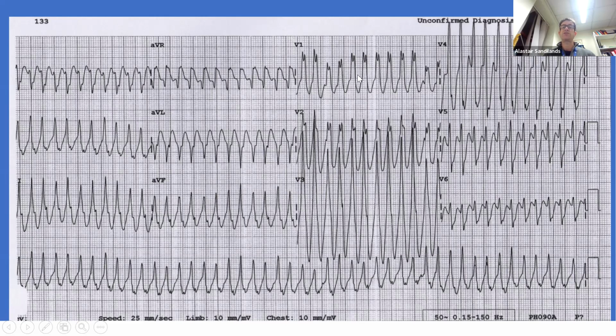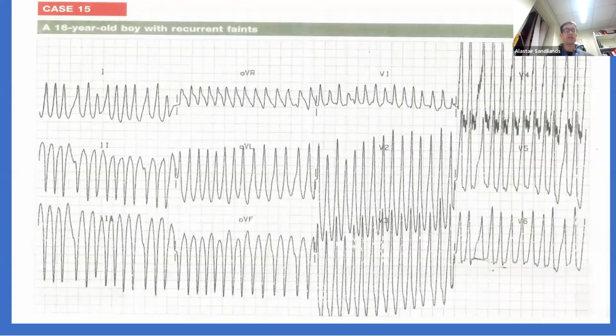Next question, is there a delta wave? So let's look along in the leads. So when we're looking at these leads, yes, I say there's a delta wave here going up like that. And so this is evidence of your antidromic tachycardia going down the pathway and back up the node. Okay, antidromic tachycardia going down the pathway, back up the node. Have a look at this example, please.